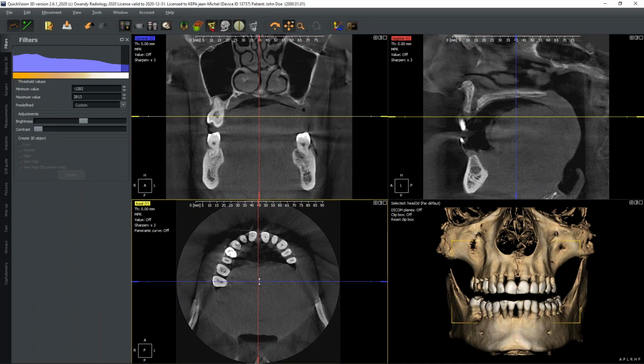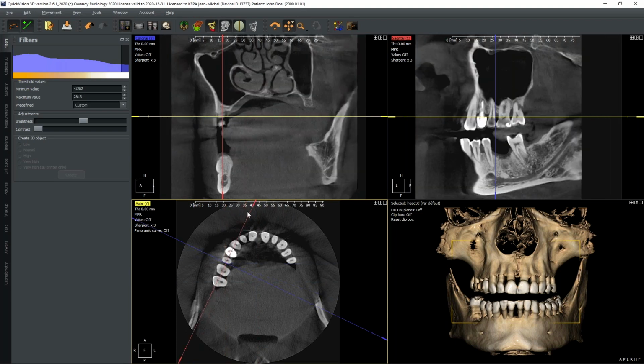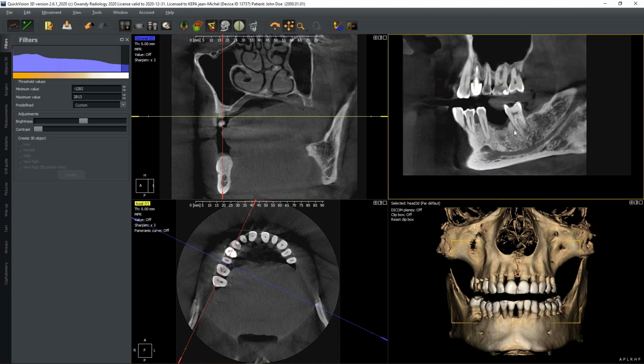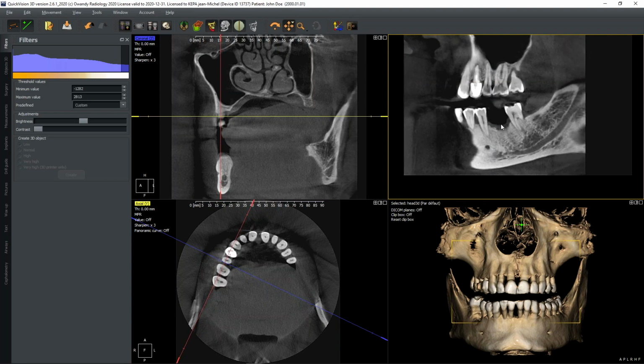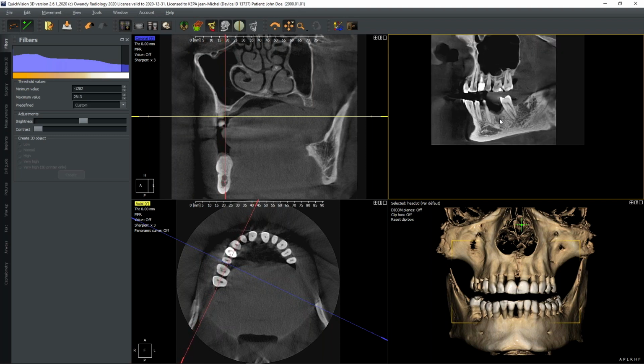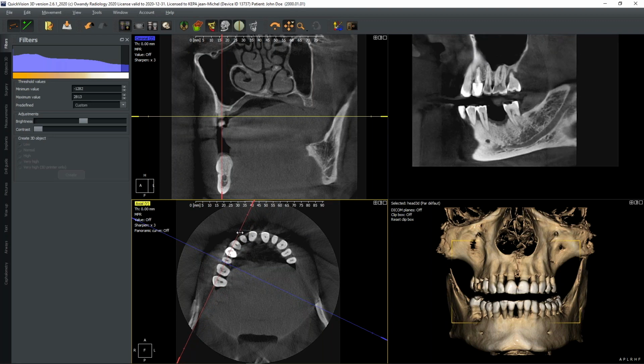Okay, I start from the axial view here. I align to the bone, and you see on the right top here, the sagittal view. The sagittal view, we have some function able to see the lines or not. I just use Control plus Wheel, and I make a tour on this side. Okay. You may also pick up directly the red line, and I move inside my patient. This is the first step.